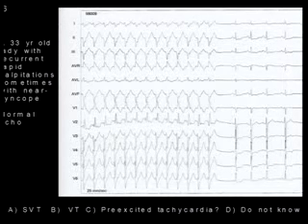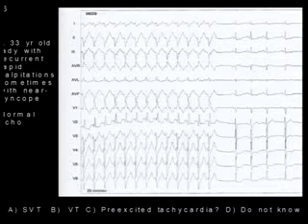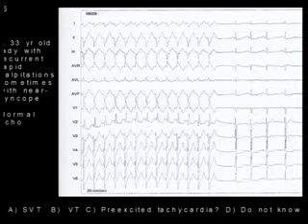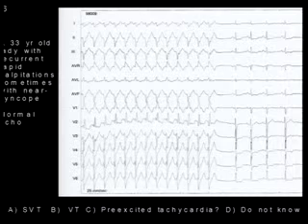So the commonest cause of a pause is a blocked PAC. And the problem is you can't always see the PAC. You have to look for it. So where you look, if it's not obvious, is in the T wave preceding the pause, and you compare it to the other T wave. So if you can just hit next on this, please. We've blown that up.